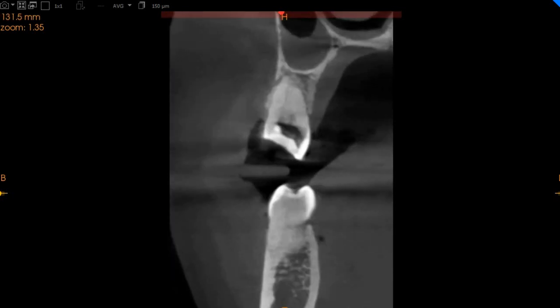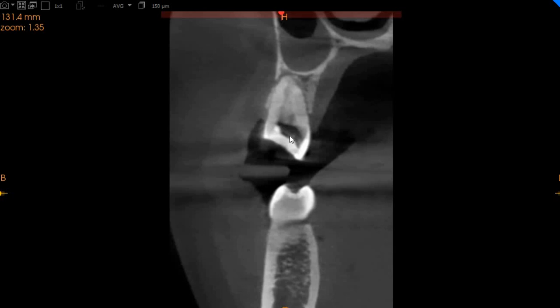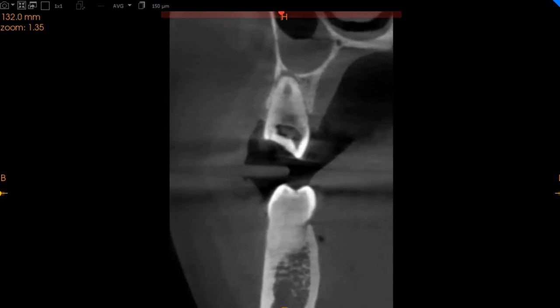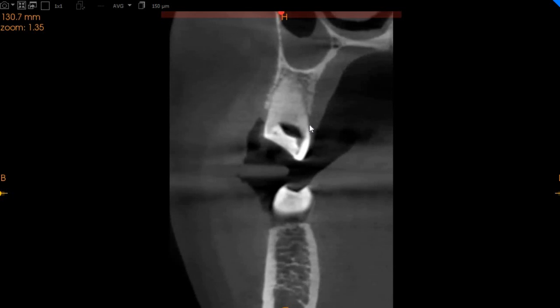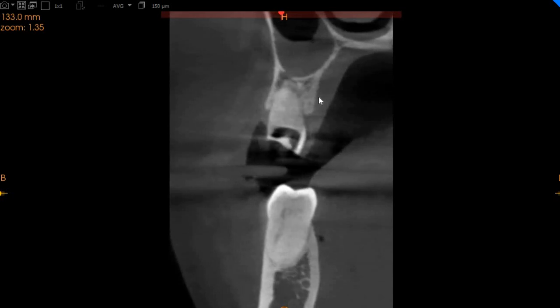Moving to the upper left 5, the upper left 5 is again non-root canal treated. There is a distal cavitated lesion. This tooth has a temporary restoration material. We're assuming there is a huge canal in the middle of the tooth. There we go. That's one single canal there, but we can also see a lot of affected dentine associated.